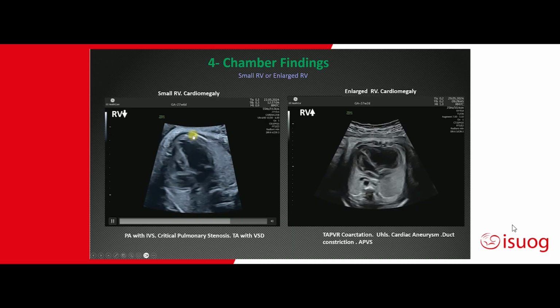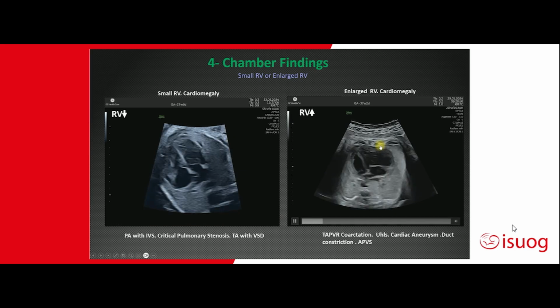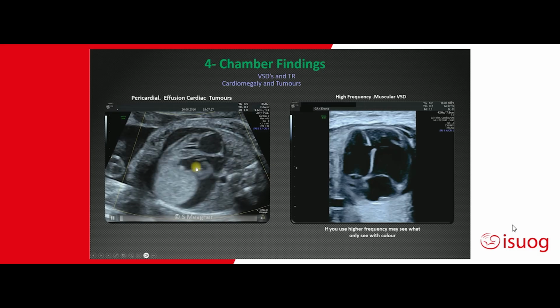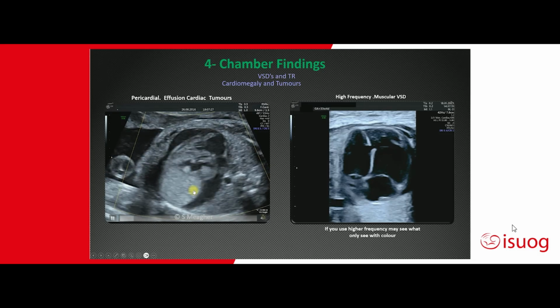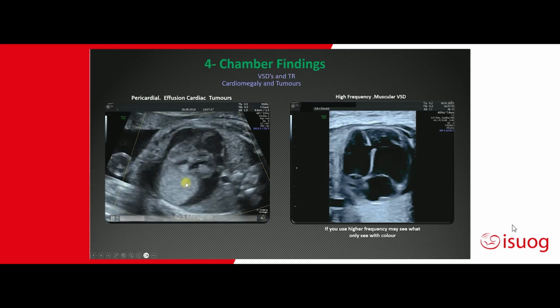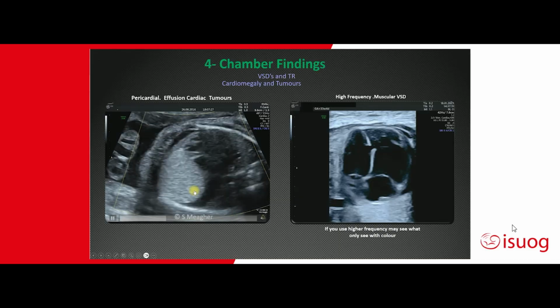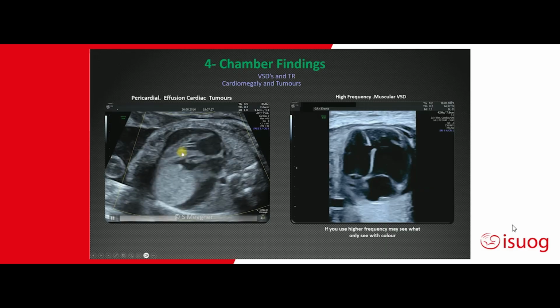Next, you see in this case descending aorta, and therefore this is the right ventricle, which is grossly enlarged with pouching of the right cardiac ventricle in a fetus with a cardiac aneurysm. And then this case here, a very obvious abnormality with a large pericardial effusion, descending aorta, left atrium, left ventricle with a cardiac rhabdomyoma. Remember, once you see one, you then go looking for more.